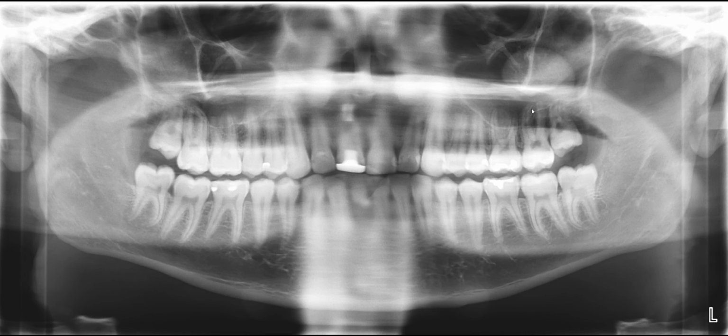Where this could potentially cause a problem is, say, this becomes too big and blocks the osteomeatal unit or the drainage pathway. In that case, you can imagine the maxillary sinus would be filled and will certainly become symptomatic. So that is the major learning point from this radiograph.